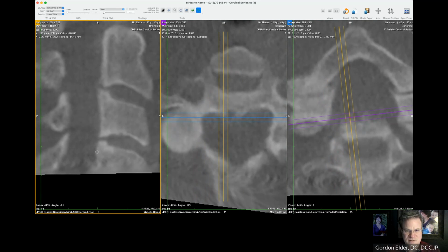If you remember, George's line is when you're looking at a lateral, full thickness, and you draw a line down the back of the bodies, they should all line up, right? Otherwise, you're thinking anterolisthesis or posterolisthesis. It's slid forward or backward. Like, look, this one looks like it's gone a little bit forward compared to C3, but C3 on 4 looks nice and even. Now, sometimes, depending on the angle of the C2, C3 joint, it can be misaligned, and this still looks even. It hasn't moved the needle so much on that.